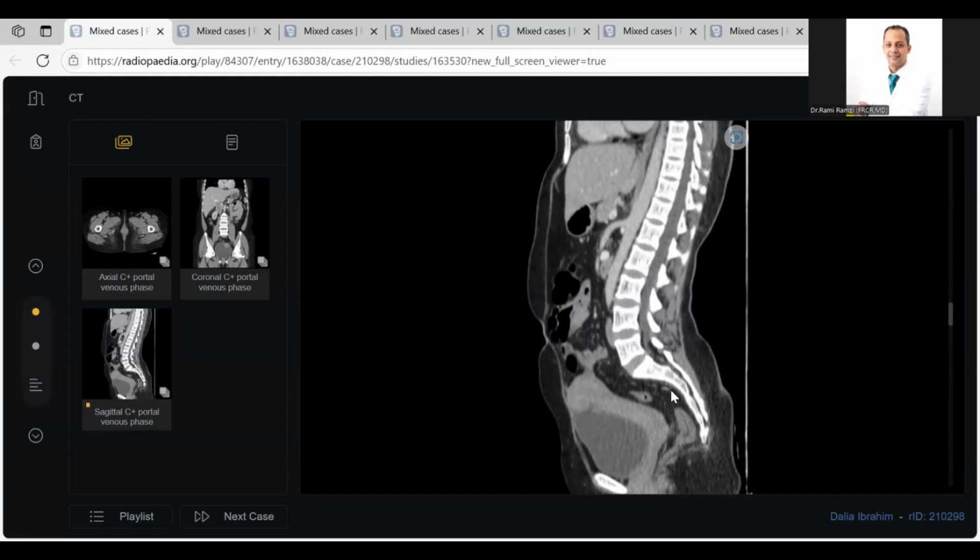However, I would like to have a delayed CT scan, after 10 to 15 minutes. That will allow the bladder to fill and might allow retrograde spillage of the contrast into the endometrium and then into the vagina, which will further confirm my finding in this case. The patient has no time to wait. Do you have any other clue to confirm your diagnosis, please? Sir, the defect is very much clear.